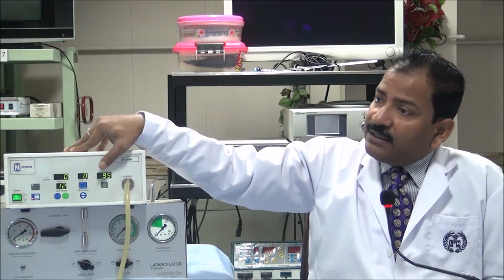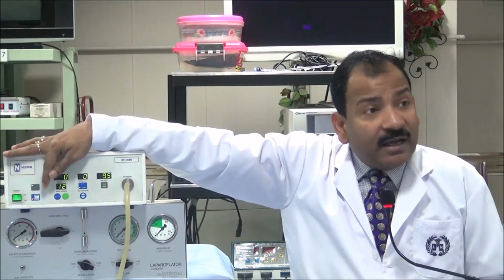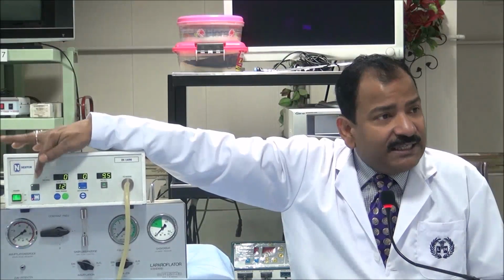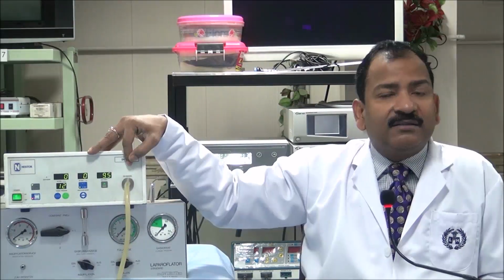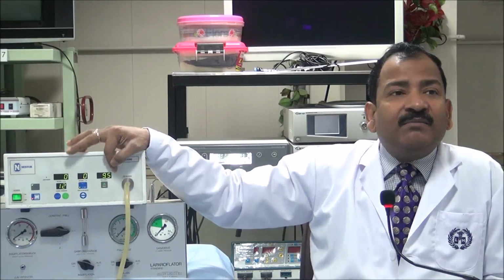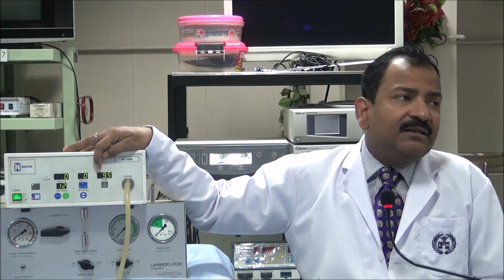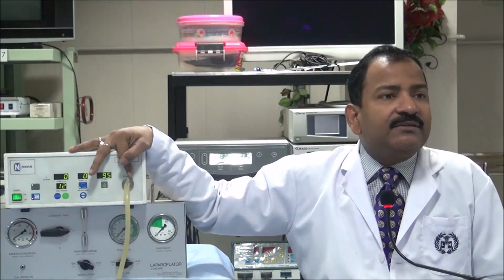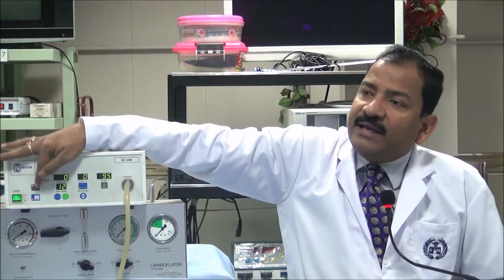But remember, this range of 1.5 to 6 I have given for a preset pressure of 12. If I increase this preset pressure to 18, then this will increase, because now the gas is more compressed. Isn't it? If I increase this to 18, then it will become minimum 3 and maximum 9. Why am I telling you this? Because in some surgeries, SAGES guideline, some books, the amount of gas which is required before putting the first trocar is written as 3 to 9 or 3 to 10. Why? Because they have kept the limit at 18.